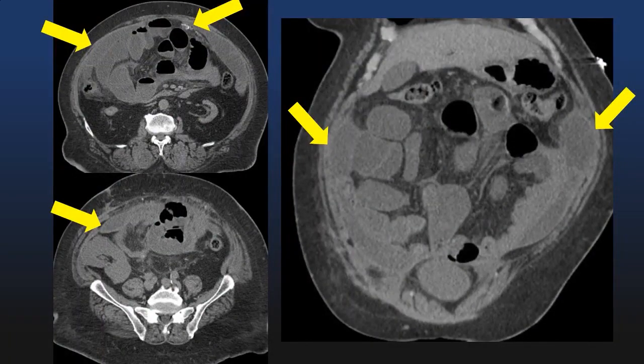Well, here's another person with not simple appearing ascites. There are loculated collections of fluid on both sides of the abdomen. Also notice that some of this soft tissue in the omentum abutting this collection is calcified, and that the patient has a transplant kidney. They're also presenting with a small bowel obstruction. Notice that the bowel loops are centrally located within the abdomen at a transition point of this obstruction here.